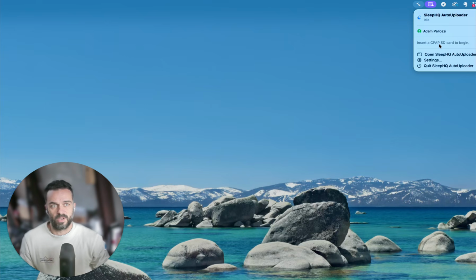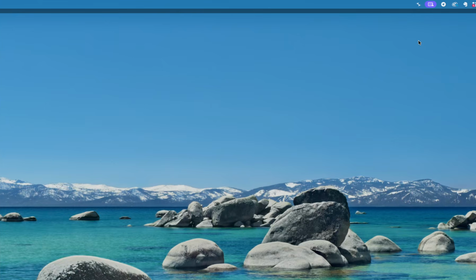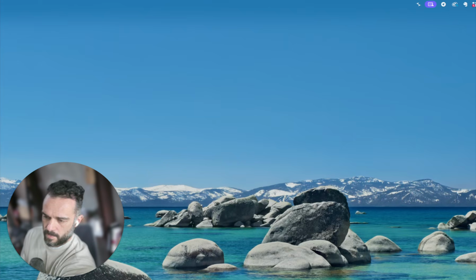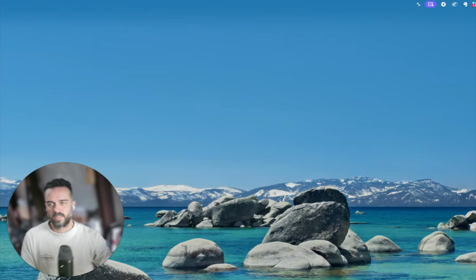So that was the entire process. It didn't come up in here, but there was a little notification that popped up on the side of my screen that said the upload is complete. You can now take out your SD card. So essentially that's it. And the next time when I put my SD card in my computer, I can do it now. It's going to do the same thing.